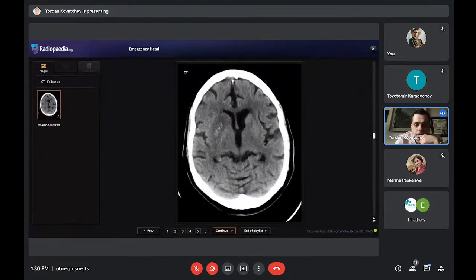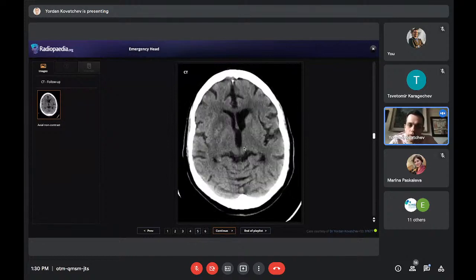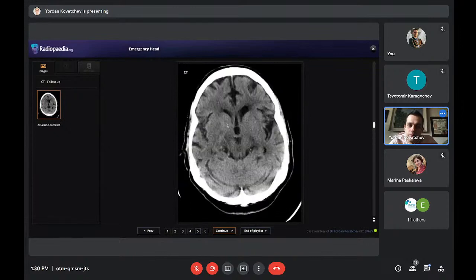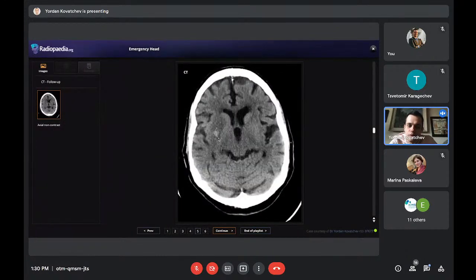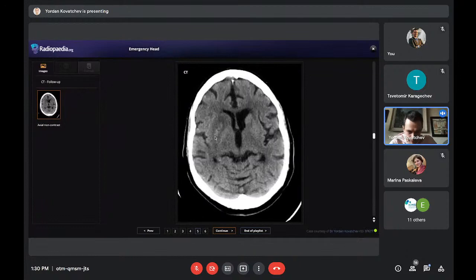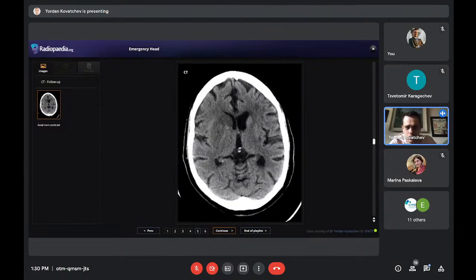This is the area that's of interest. So at least we should probably have an idea in your mind. Is it hypodense? Is it hyperdense? So that's why we divided the presentation like this, because this often is the starting point. What we had here, big hyperdense areas, are now pretty much hypodense, except for these small points, but they're not really bright. This one here, it's like punctate hyperattenuations. But overall, the ischemia is developing.